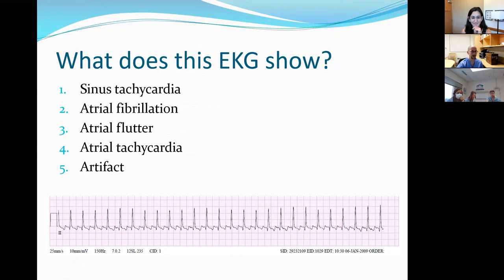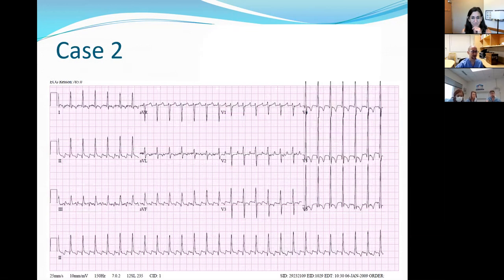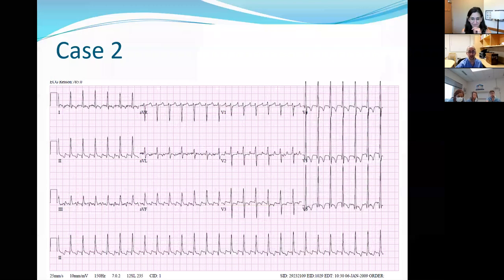Great. So 54% got this one right. This is atrial flutter. Now, what I'll say is it's tough to see this. Number one, I gave you a single lead and I told you don't do that. That makes it tough, but even when you look at the 12 lead, it is tough to guess this and get it right.